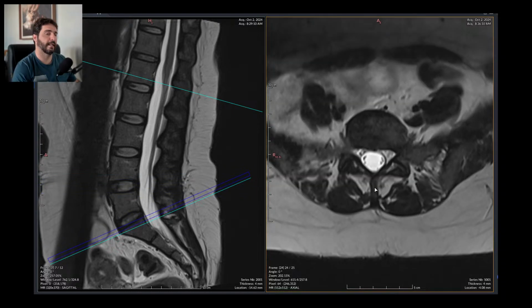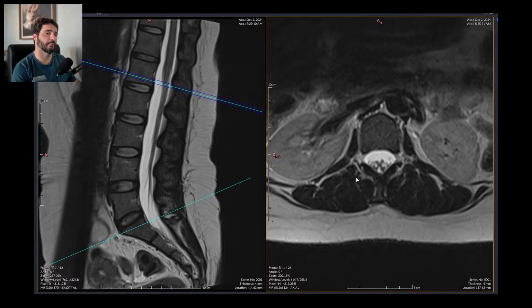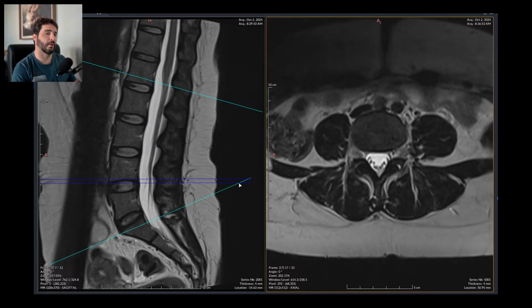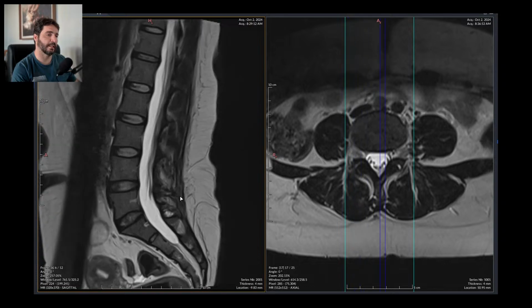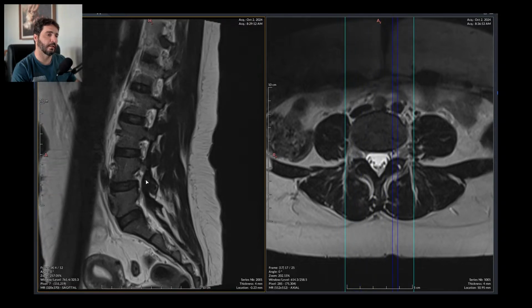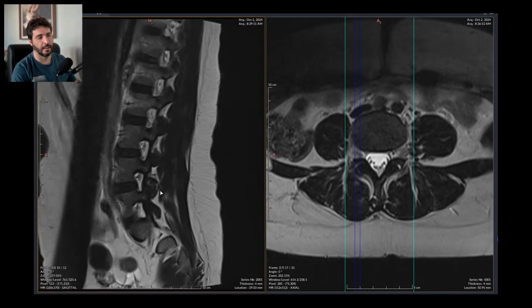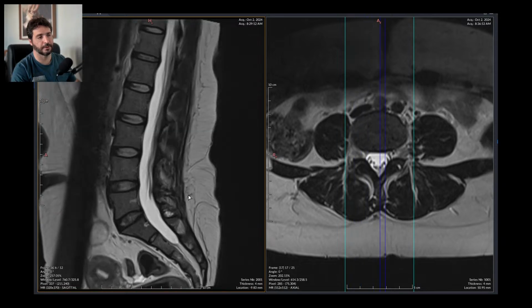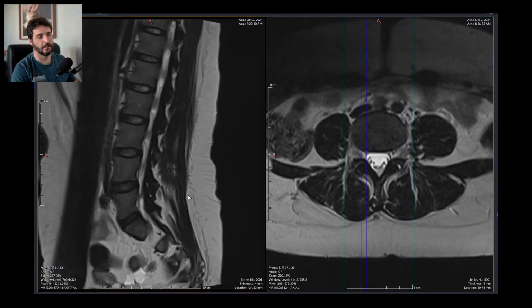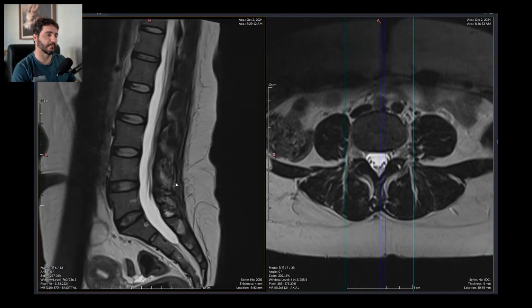So there is fat infiltration and hypertrophy of the perivertebral muscles, and there is arthrosis and some fluid in the facet joints of L3, L4 and L4, L5, which is hypermobility or synovitis, and is painful by themselves.